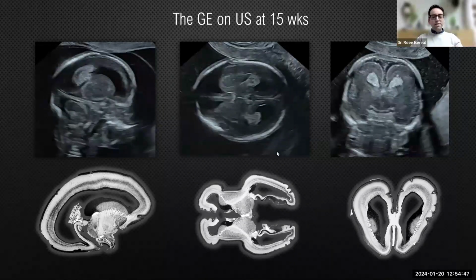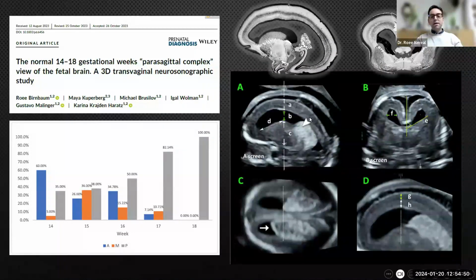Now, just a few months ago, we published this work in which we aimed to describe the normal developmental patterns that occur in the parasagittal images. The reason I show you this paper is because the parasagittal image is the place to study the ganglionic eminence on ultrasound, taking into consideration that, as opposed to MRI, we are limited in differentiating between the two layers. So we have this ganglionic eminence basal ganglia complex here, marked by C, and then you have to differentiate this area between the choroid plexus and the mantle of the brain.